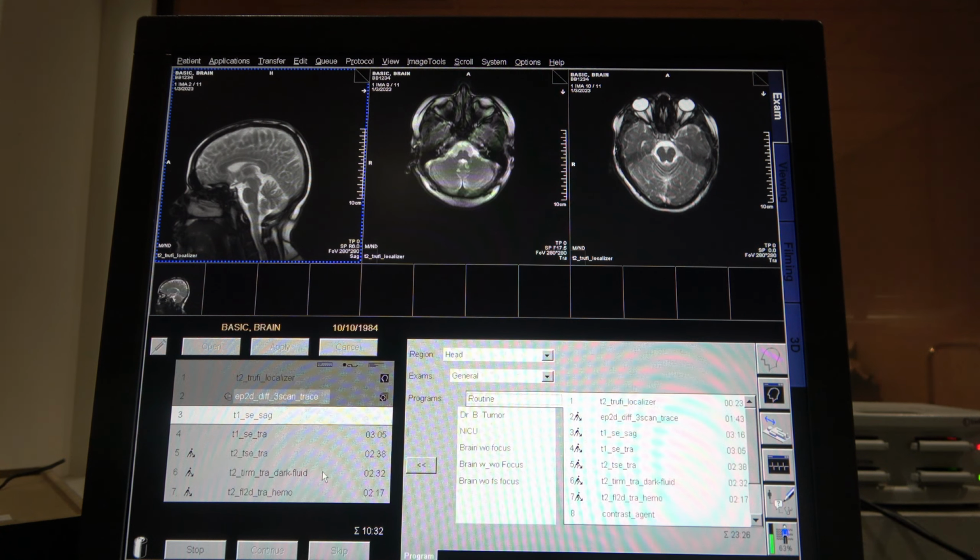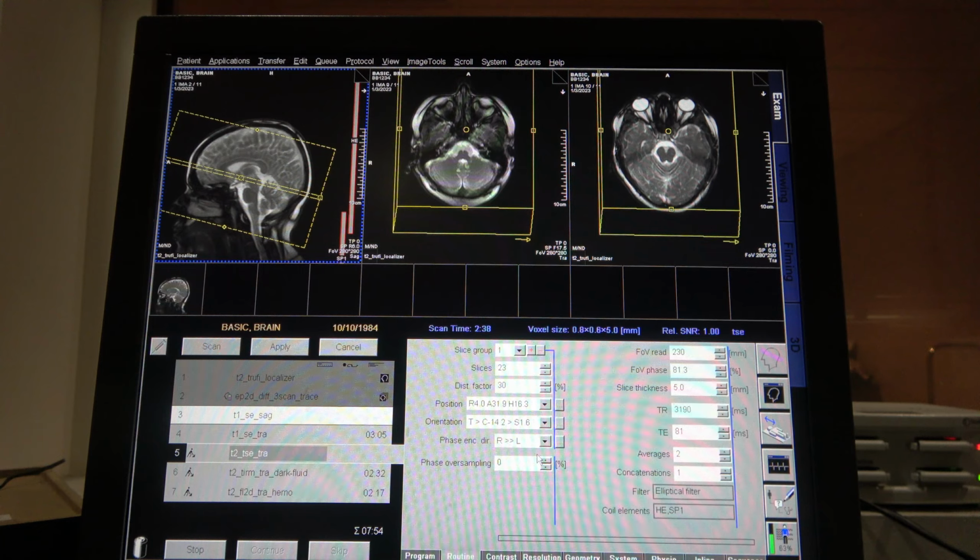All right. Now, let's do a coronal. We have an axial, we have a sagittal, and we have another axial. But first, let me do another axial that also goes right to left. You see, I opened the tab. And how do you open a tab? You double click, okay? All right, so now this one's right to left.